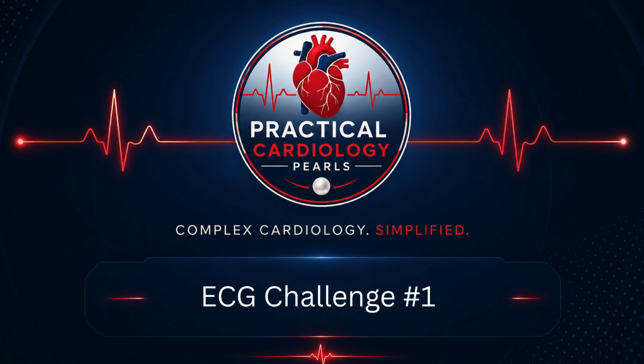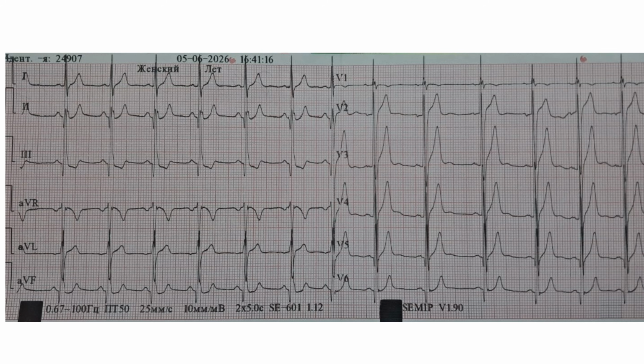Today, we'll discuss an ECG case together. Before we begin, pause the video, analyze the ECG, and try to identify the key finding. Then, we'll review it together step by step.